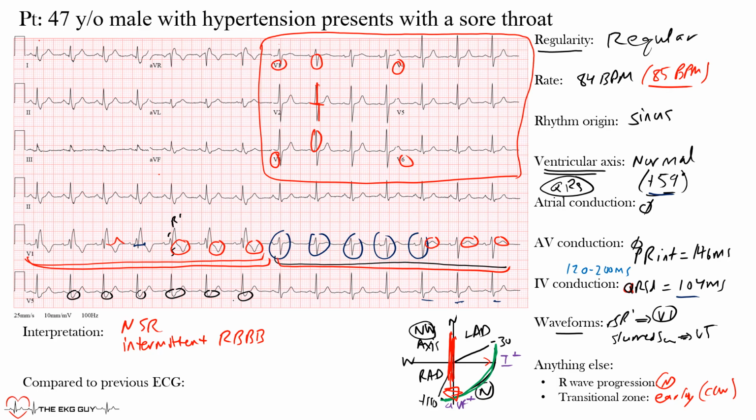Okay, but discordance, in which the QRS complexes are going one way and the T waves the other way, in a right bundle branch block or left bundle branch block, is normal. Okay, so hopefully that makes sense. We said no PR elevation or depression, no abnormal Q waves that would suggest maybe a prior infarct.